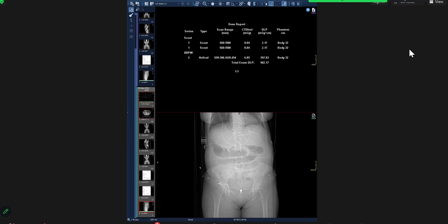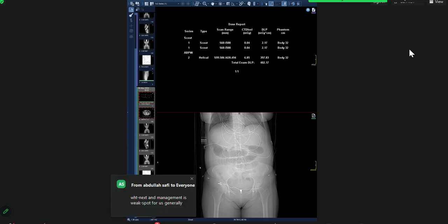Other causes of large bowel obstruction could be diverticular disease or diverticular strictures or things related to diverticulitis. It might be related to radiation if the patient has prostate cancer and then bowel obstruction because of that. Then one very important thing to see in elderly people: the small and large bowel loops are dilated, there's no transition point and there's no cause. So that is the pseudo obstruction, or Ogilvie's.